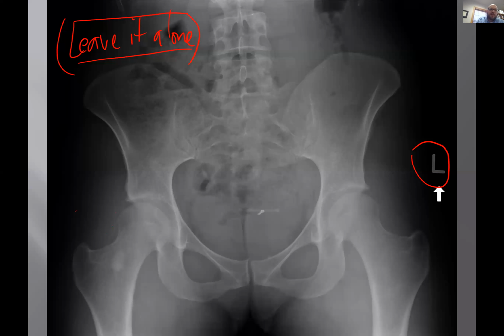It's good to remember that there are, in the literature, leave-me-alone lesions, stuff that you just let go. And it's easy to let it go, I think, if it doesn't hurt at all in the right hip. It's harder to let this go if the patient's got a little labral tear, or a little impingement syndrome, or a little bursitis or hip pain for whatever reason, subluxation, and now you have a bone island. You think that somehow that makes it not a bone island. That's when it gets you in trouble. So I want to remind you to leave these solitary brush border bone islands alone.